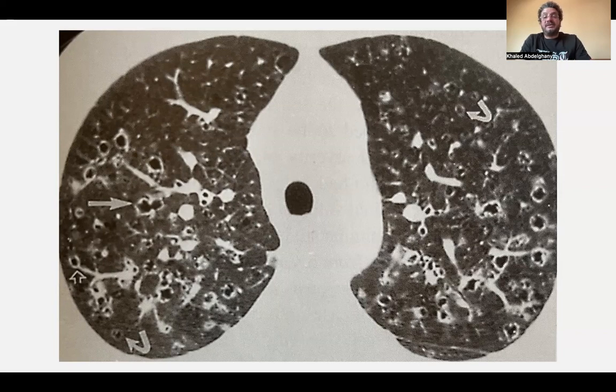Is it bronchiectasis? Not a bronchiectasis, because they are not communicating. You cannot follow the nodules to another dilated parent bronchus, nor are they branching. And we will comment more about the bronchiectasis at its image. So this is a PLCH diagnosis.